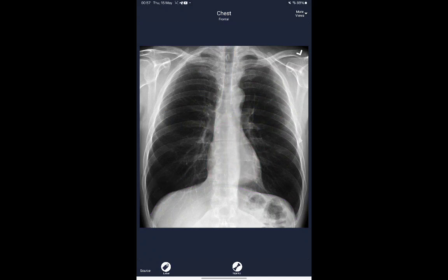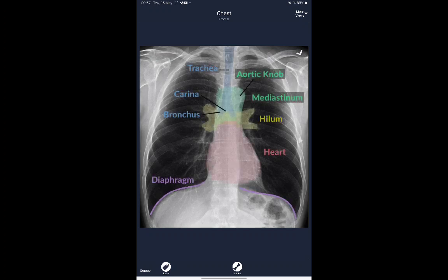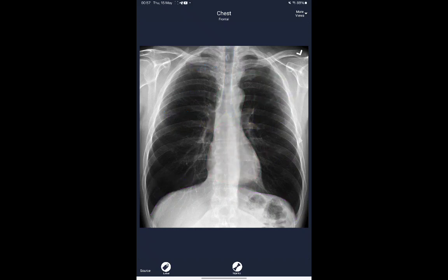If we look below, this is the diaphragm. Below each lung, this is the diaphragm in the purple color. This line is the diaphragm. We can notice here the left side with the gastric bubble and splenic flexure gas within the colon. This is regarding this image.